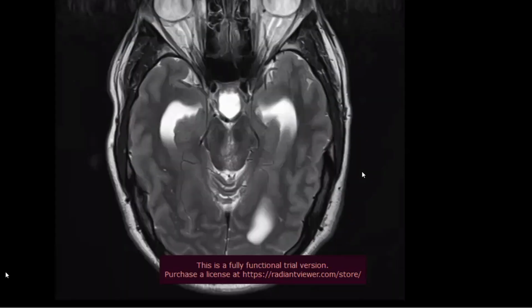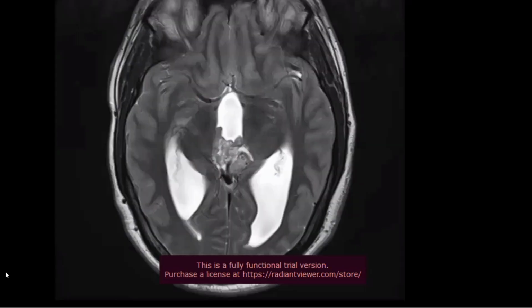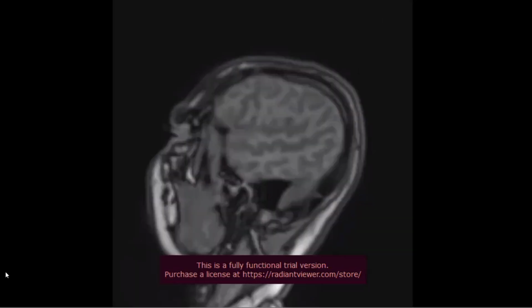I would like to see some other images. Can I see post-contrast images or FLAIR images? No, sagittal. This is the post-contrast image.